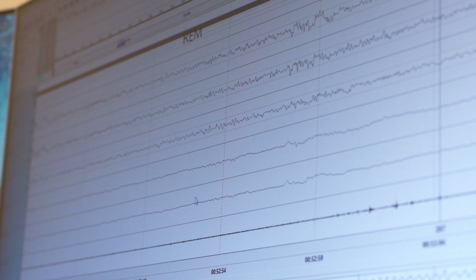No. If you're thinking that's a K complex, no, it's just a vertex sharp wave or a slower wave, and now we're going into REM. Now comes a special case. The computer has marked an arousal here, but it's not one at all. Because in REM, arousals can actually only be scored if there's an EMG increase of at least 1 second. That means there's no arousal here at all, but rather it's more proof of this mixed frequency that we see in REM. No, that's nothing to worry about here.